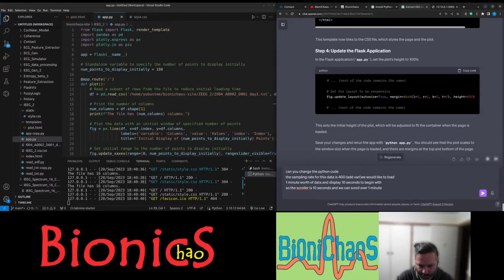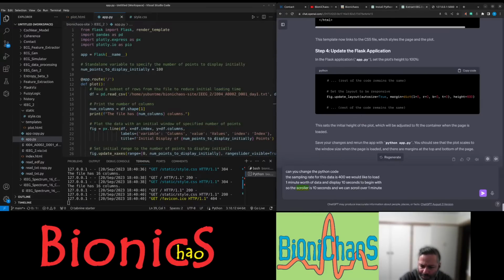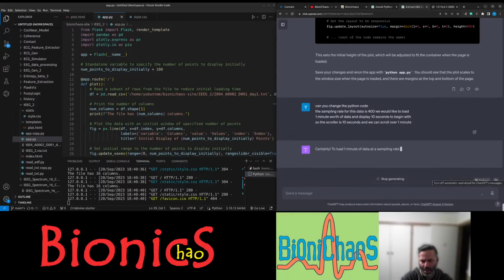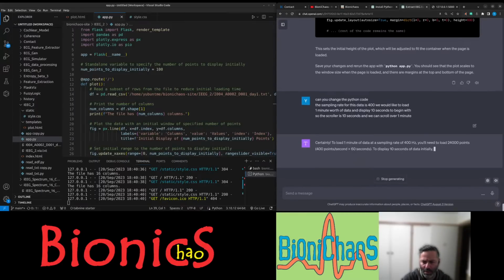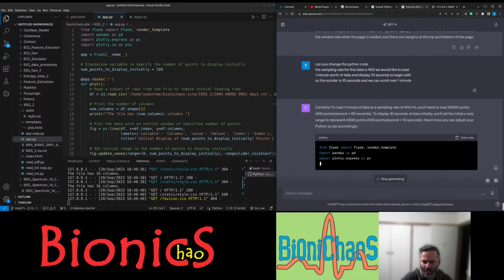Actually, we don't need a variable for this because this will be hardwired. Okay, 24,000. How about we start? Do we need 1 minute?